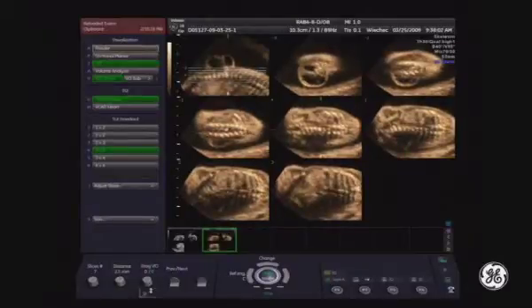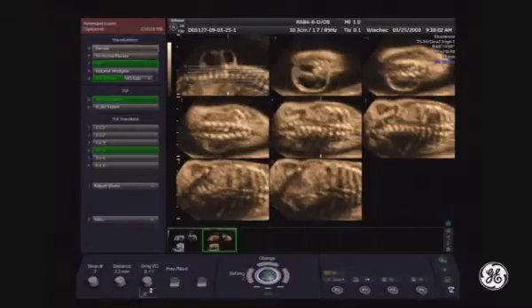And in this slice, which is described with the figure -1, you can see the last pair of the ribs. So this is here. And the defect starts just below it because you can see this dilatation and opening of the arches here. So from the level L1 down, you can define that in this case we have a spina bifida. This is very important for the pediatric counselor to provide him with this information.